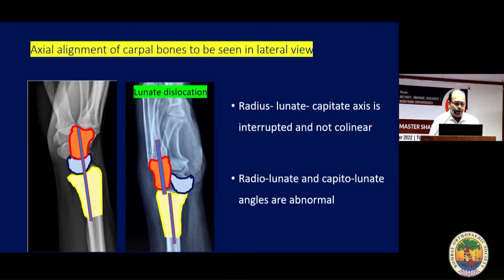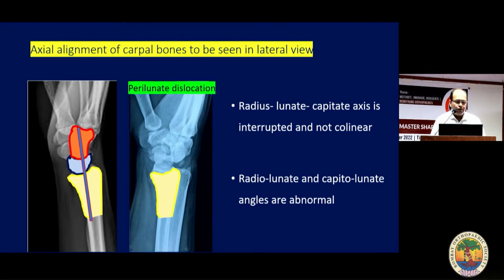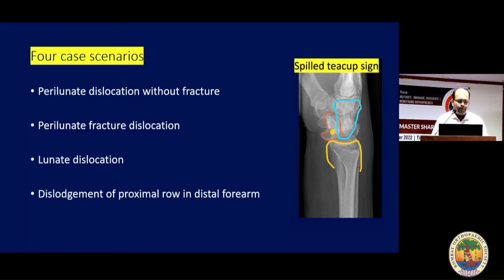This is the normal alignment of the carpus in the lateral view. When we talk about a perilunate dislocation, there is the distal radius and the lunate, and the capitate is out. That is a perilunate dislocation. Again, what we have to understand is the axis between the radius, lunate, and capitate. Then I would like to talk about four important case scenarios in radiology. We either deal with a perilunate fracture dislocation, a perilunate dislocation without fracture, a simple lunate dislocation, or dislodgement of the proximal row in the distal forearm.